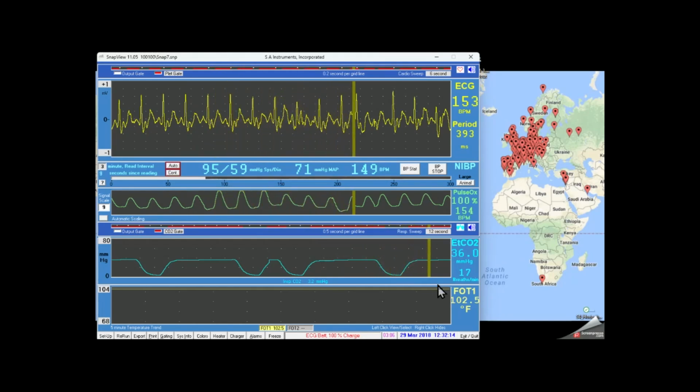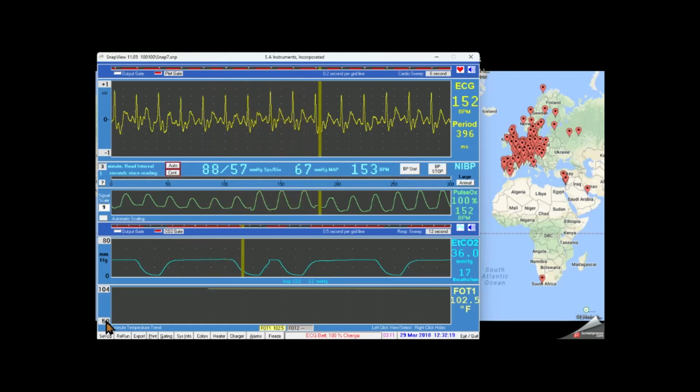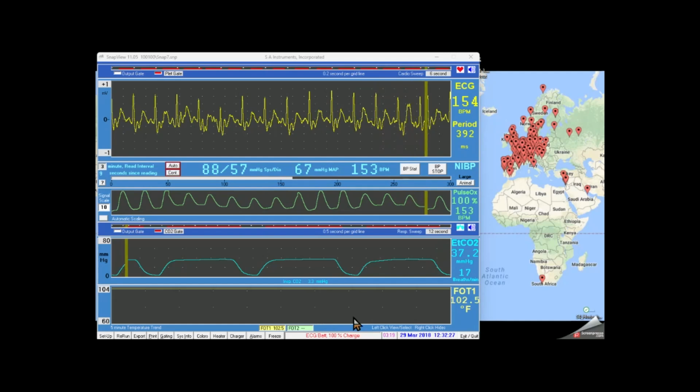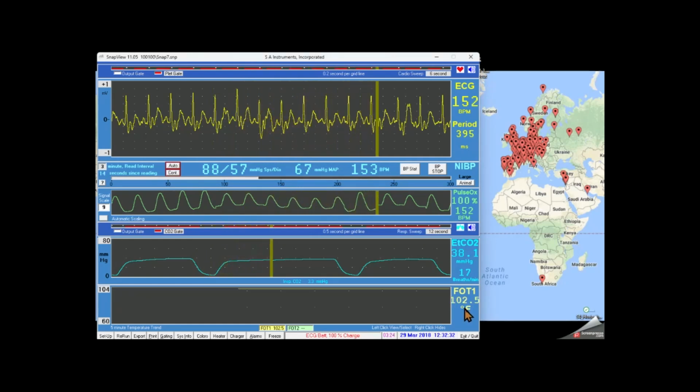Temperature measurements are displayed in the 5-minute trend, with the most recent measurement entered on the right side of the display. The system normally has one channel of fiber optic temperature, but a second channel is available as an option. Two buttons appear at the bottom of the display. These buttons select which measurement is displayed in the trend and in the digital display on the right. Toggle between degrees C and degrees F by clicking on the unit indication.